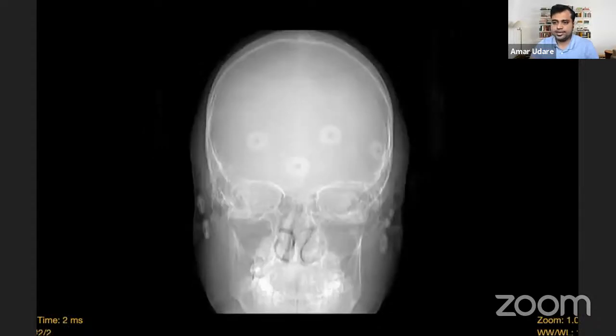okay, so these are images that we took later. Does anybody know what these are? Our differentials were similar: eosinophilic granuloma or some kind of infection. Hemangiopericytoma is also a good thought, but again, common things should be top of our differential. So does anybody know what these things are on the skull tomogram?